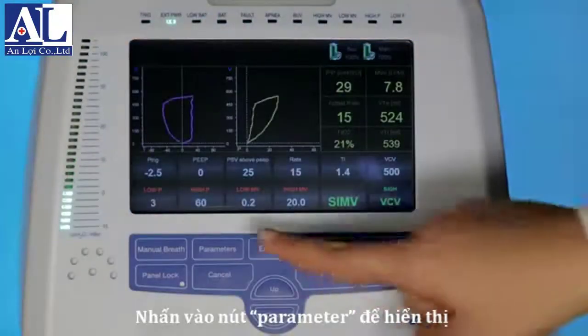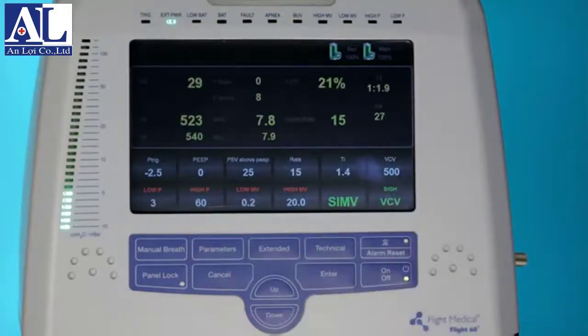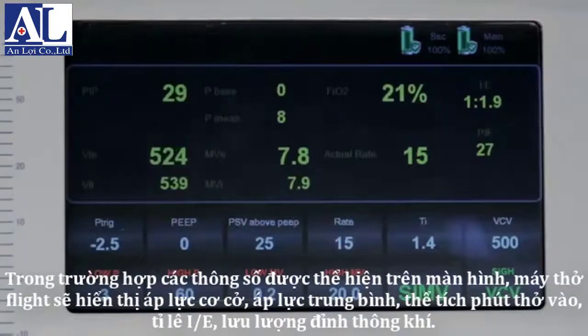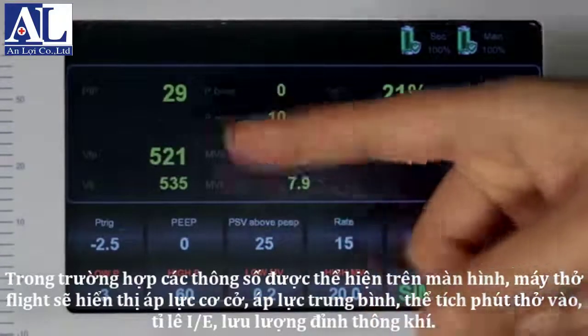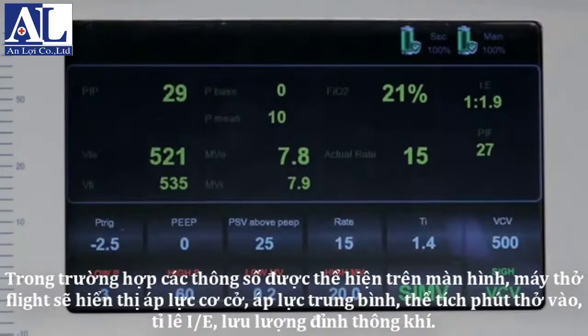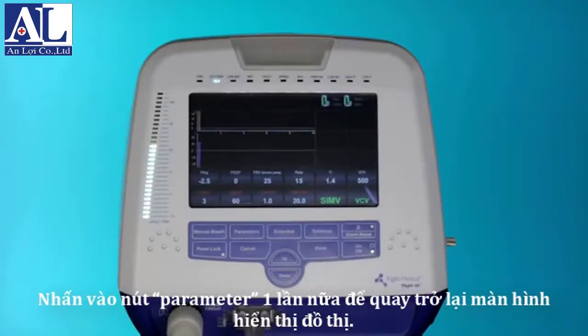Press the Parameters button to switch between graphic and numeric display. In addition to the numeric parameters from the graphic display, the Flight 60 ventilator displays baseline pressure, mean airway pressure, inspiratory minute volume, I/E ratio, and peak inspiratory flow. Press the Parameters button again to switch back to the default graphic display.